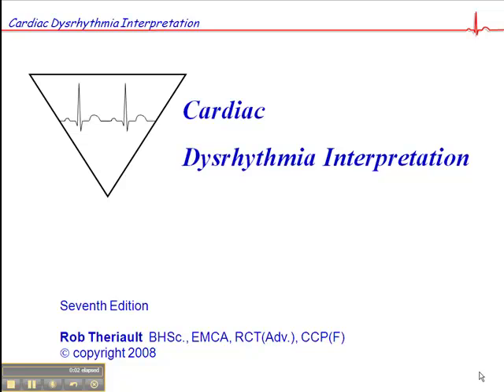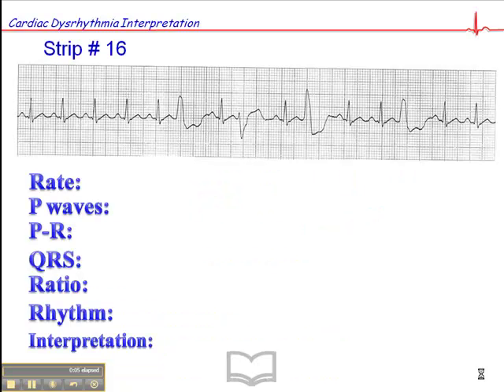Now if you'll turn to ECG exercise number 16 on page 92, and we'll begin with a heart rate here. So again, remember, we always try to interpret the underlying rhythm, and then we describe the FLBs, the funny looking beats. So the heart rate here is approximately 120, and this is an irregular rhythm, so you could interpret this heart rate a little bit differently. The gold standard always being check the pulse. Does the pulse match the monitor, those kinds of things.